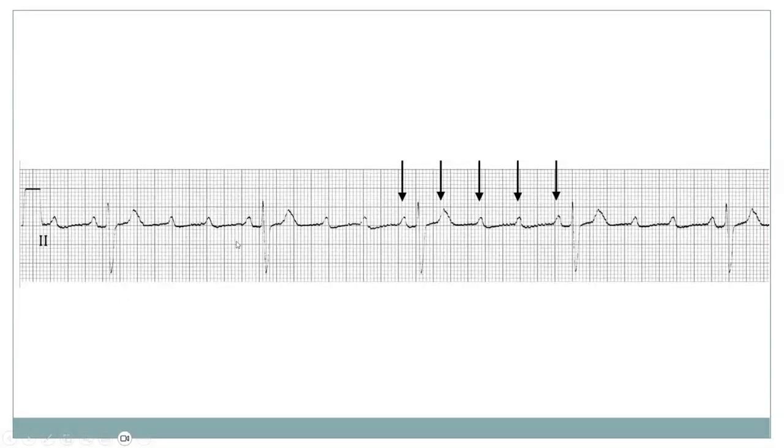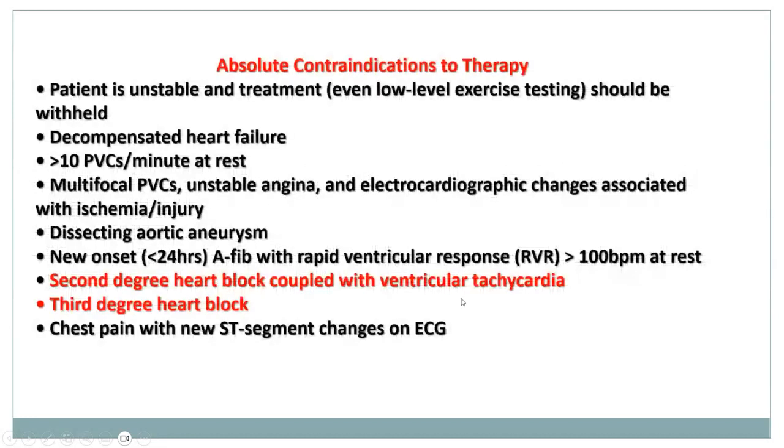Let's look at this ECG. P, QRS, T, then P, P, P, and 1 QRS. So 3 P's, 1 QRS. It should happen that after this P we would have a QRS, after this P we would have a QRS, after this, but this didn't happen. 3 P's and only 1 QRS. So this is what is meant by high degree atrioventricular block.